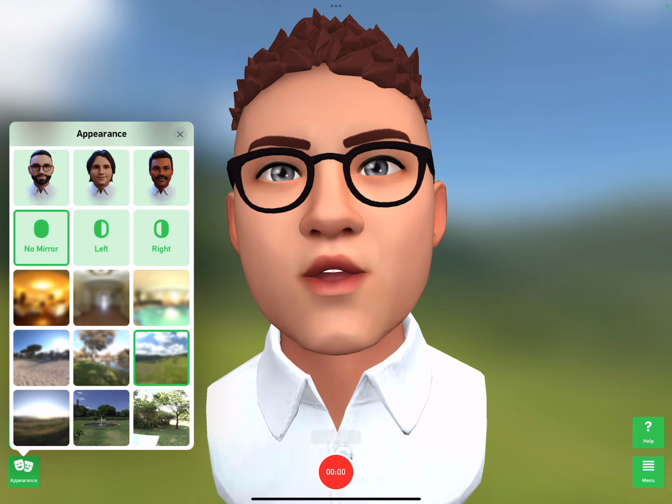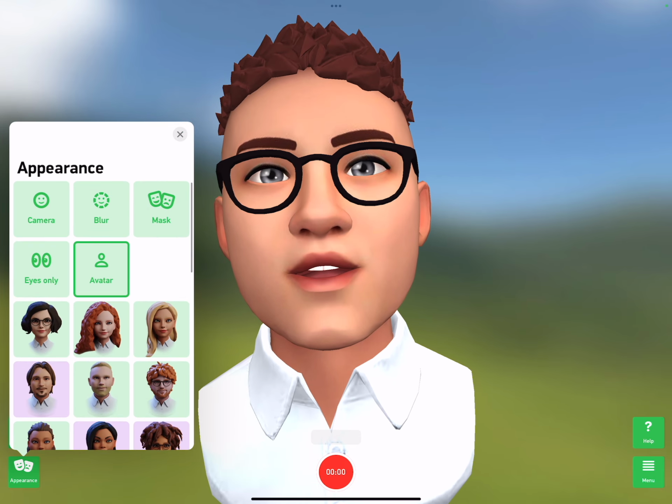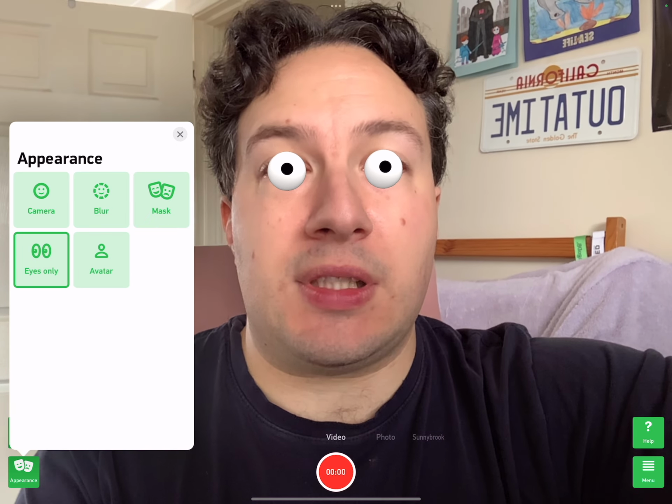And finally, when talking with clinicians, they asked if I could make people laugh, because laughing makes us smile using a different part of the brain than if you just ask someone to smile. So you tell me, does this make you laugh?